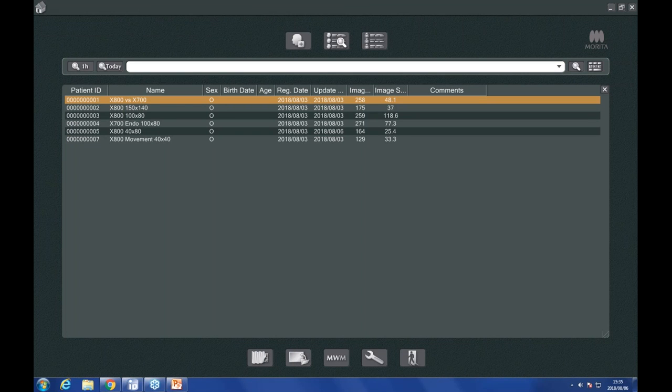Now I'm just starting up my screen sharing. So hopefully on all your sides, you're able to see what I see. And what you're seeing in the background here is the user interface for our Idixel software. Now, this home screen, as we call it, is basically the list of patients in your database. As you can imagine, we've anonymized everyone, so the names of our patients are very much machine-centric.